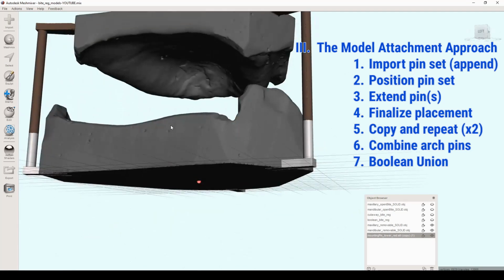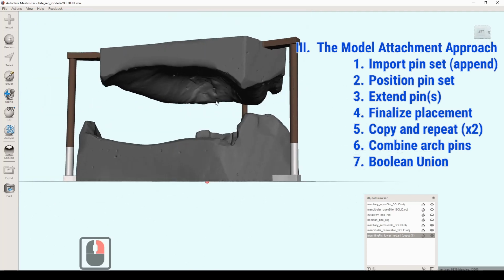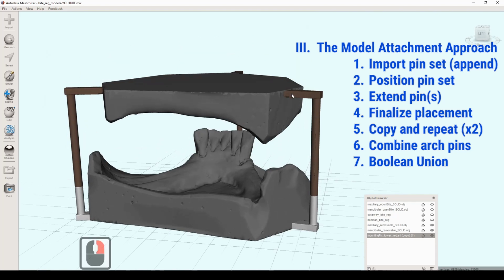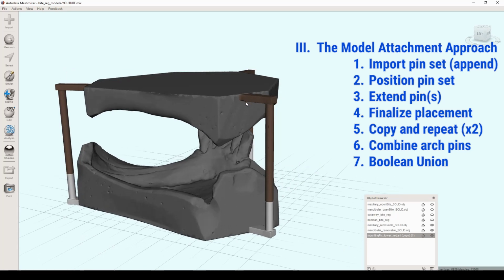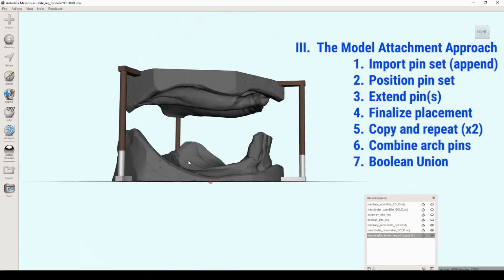So when you're doing this at home, on your own, and for future reference for me, for sure, when you're setting this up, you want these little pegs here to be a little bit lower than the exact top of this. You don't want it to be perfectly flush, either a little bit above or a little bit below, but not perfectly flush.